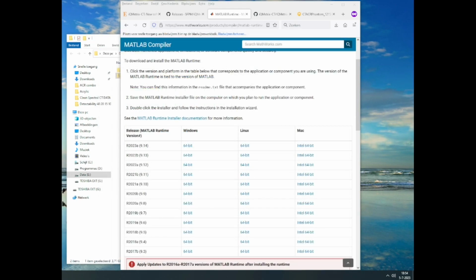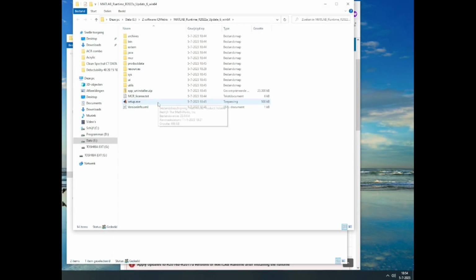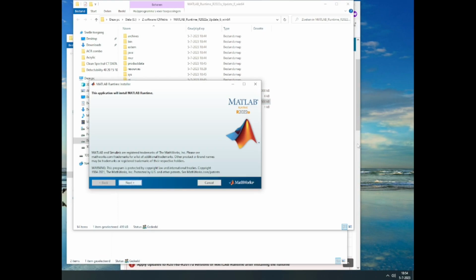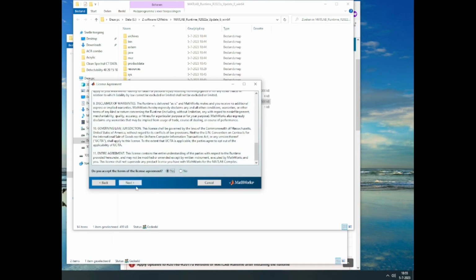Alright, we are back. I believe the file that we wanted to download is finally finished. This is the file that we wanted to download. We can open it. Seems fine. Next. Assembling product list. Maybe I will cut this part out too. I don't know how long this will take.